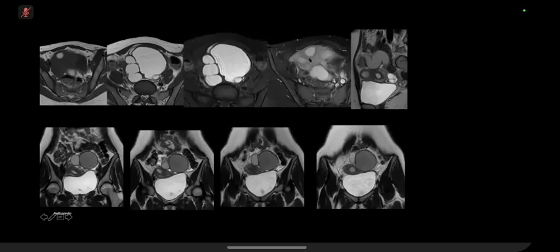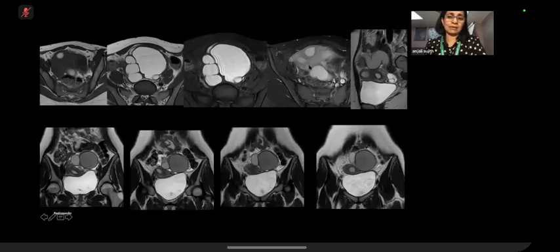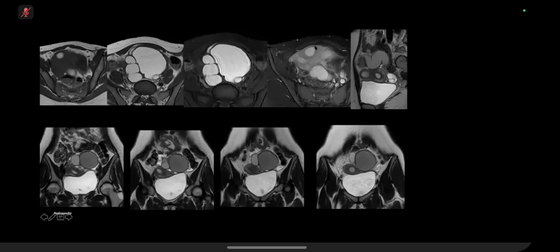The central stroma, what I could call, appears iso-intense, but some of the ovoid elements show enhancement more than the central. What is the enhancing part, the central stroma that you call? What is that structure? That is actually the uterus. That's the uterine myometrium that is enhancing. Okay, that's the uterine myometrium. Then on the next sequence, I can see 2 endometrial cavities.